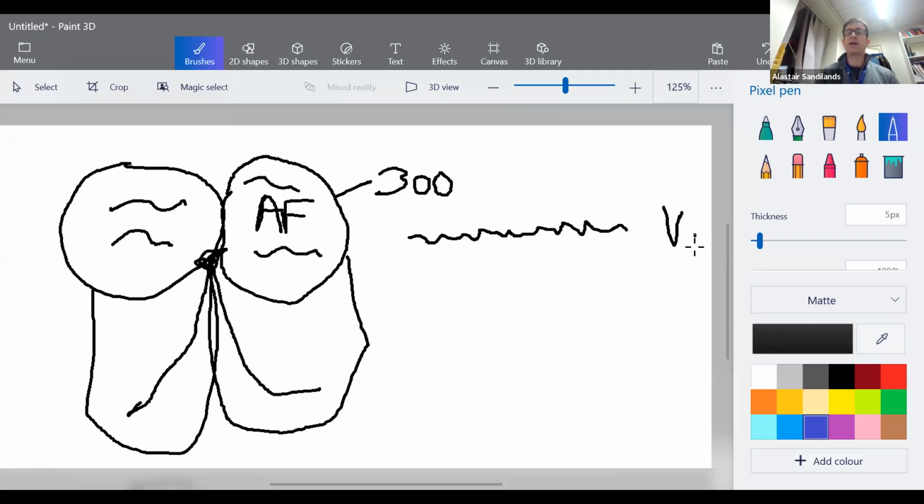V1 is probably the best place to look. We've got the wavy baseline as the atrial fibrillation conducts through the atrium, and then it conducts down the AV node, down the bundles. But of course, because the AV node is a three-dimensional structure, and because the AF is irregular, the wavefronts hit the AV node in different positions. And so what you get is an irregular rhythm.